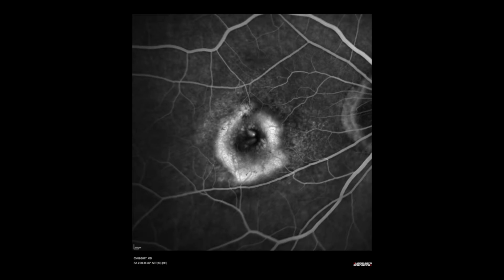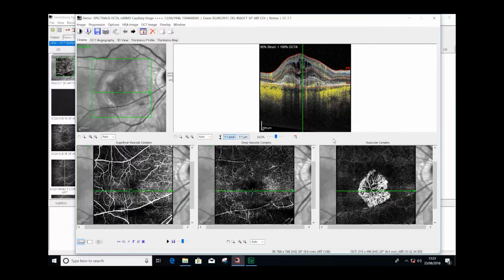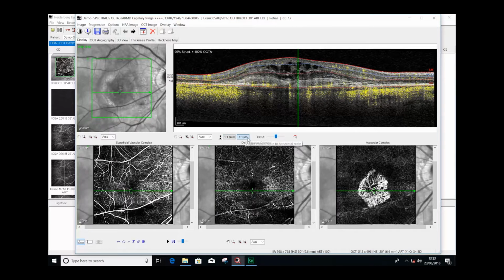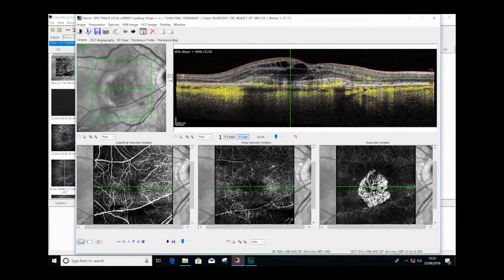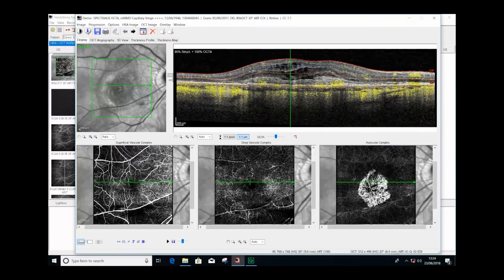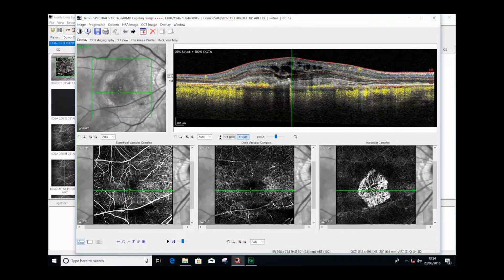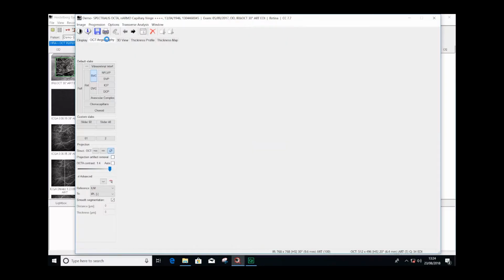All of these indicate signs of activity within a lesion. Whilst the OCTA image very clearly demonstrates the vascular lesion, it does not necessarily show signs of activity. A fine capillary fringe within a CNV lesion has been described as a sign of activity, but this is actually quite difficult to determine just simply based on visualizing the transverse section OCTA in the avascular complex.